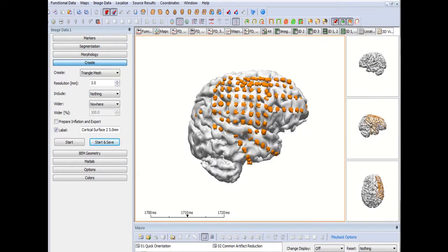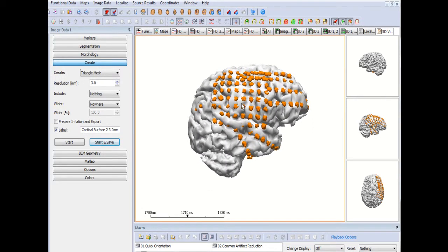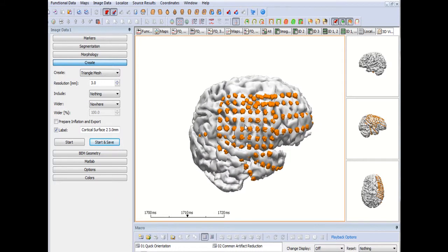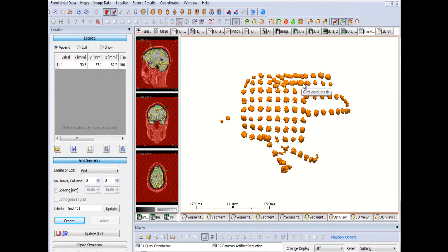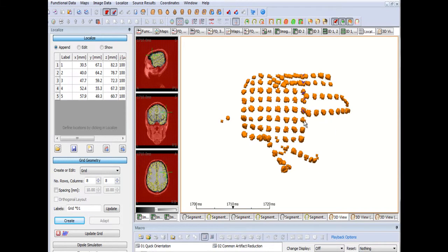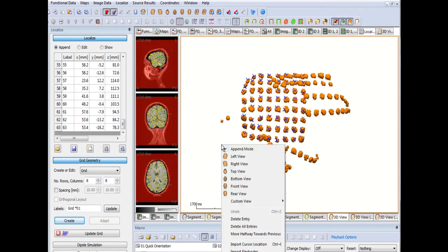And on that, we will superimpose the voxel representation of our grids and strip electrodes. We then mark each of those voxel locations with a point in space that allows us to define the entire grid, briefly across from the beginning to the end of this, to mark all 64 points in the grid. And for now, we will just focus on the grid itself.